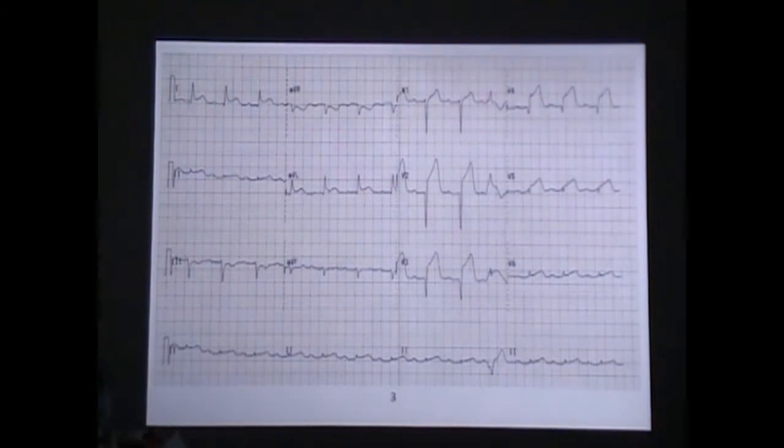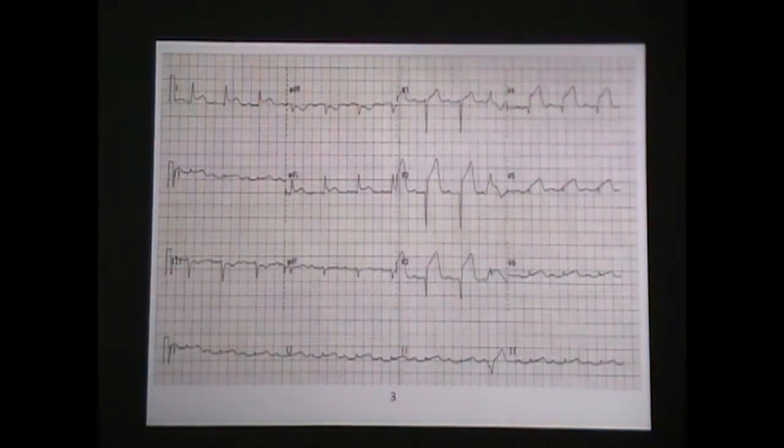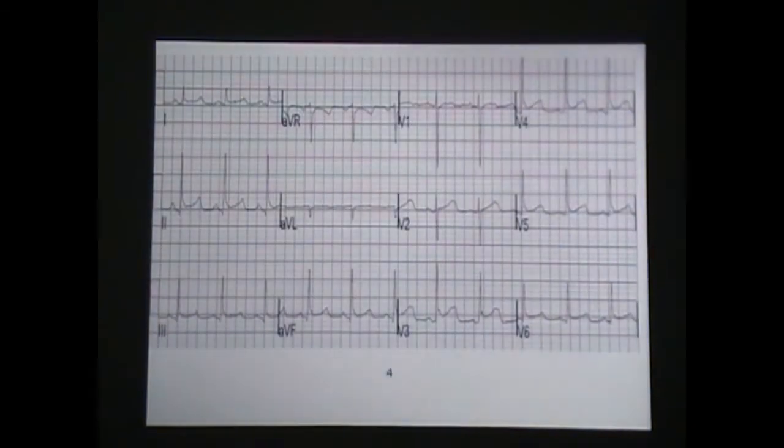Okay. Even though it's moving, it's not really significant for anything besides probably poor lead placement or bouncing on the road. I don't know if that's indicative of one thing. It doesn't pique my interest as being significant for anything. Okay, so let's go look at the next slide.